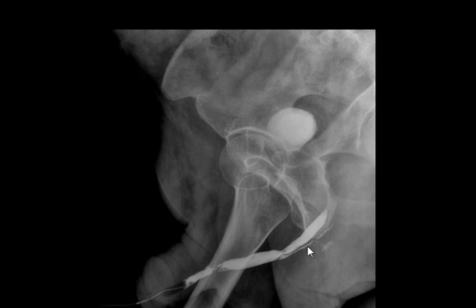Okay? The membranous part is the weakest part of the urethra. Weakest, not narrowest, even though it's narrow. The weakest part of the urethra that's always susceptible to medical instrumentation injury is the membranous urethra. So here we have multifocal strictures in a 55-year-old male, of course male, without history of trauma, suggesting chronic urethral infection causing post-infectious stenosis and fibrosis.